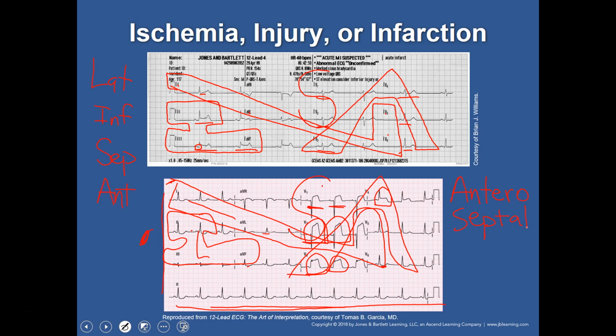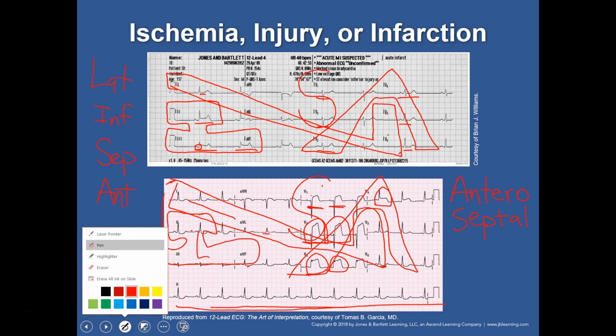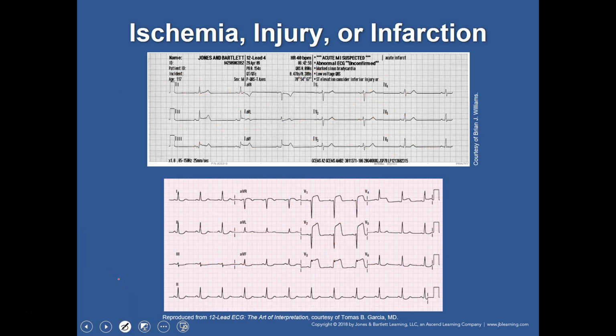So, because we involved our A and we involved our S. Now, if you wanted to, I don't think you'd probably say septal antero. I've never heard that before, but you can call it however you'd like. Just understand the anterior portion and the septal, the ventricular septum, has been injured and infarcted. We're moving on into that direction anyways, isn't it? So, once again, that is our Lisa way to do this. I hope that starts to make sense.